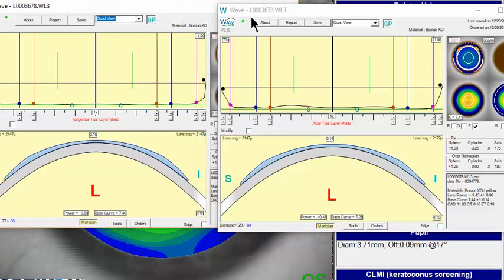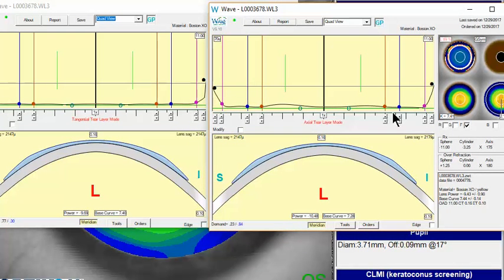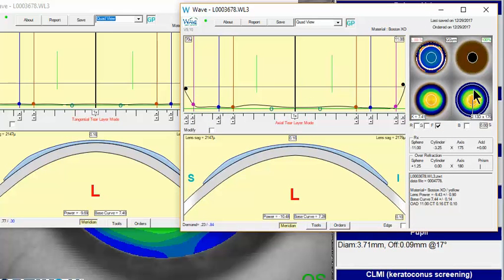And you'll see, now you still have a lens that's nicely aligned here, but now if you look at that vertical meridian, if we click over in that superior meridian, you're at 740-ish, which is about the same. But now if you look in that inferior meridian, you've dropped down to 728 from a 740. So that, I think, will give you the chance to get a little bit better alignment in all these different meridians, and you can certainly further manually adjust that by switching over to the 25% modality if you want to take that lower meridian, make it even a little tighter.